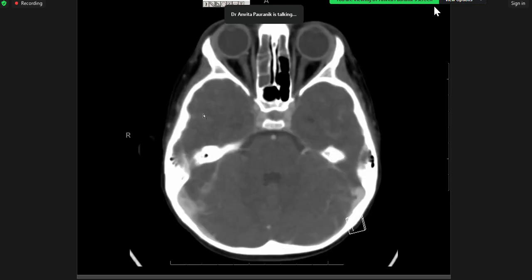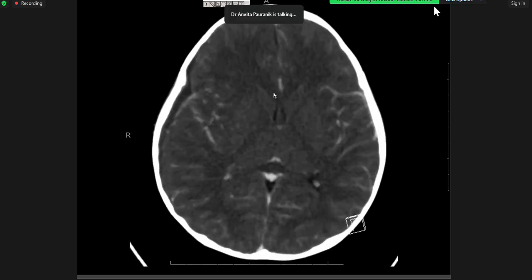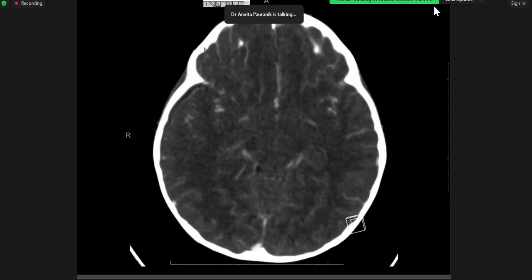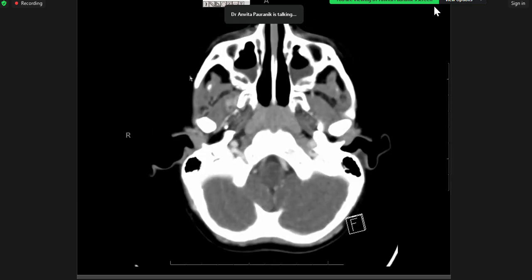This patient is different because this patient has clearly presented with this empyema and some areas of edema, some areas of venous thrombosis. So here it is relevant, right? Definitely some little bit of air fluid level type of appearance and not just peripheral thickening. So this is relevant. But otherwise, in general, it's extremely common to see fluid opacification and thickening in the sinuses and mastoids. So please don't overcall sinusitis and mastoiditis. So that was another take home.